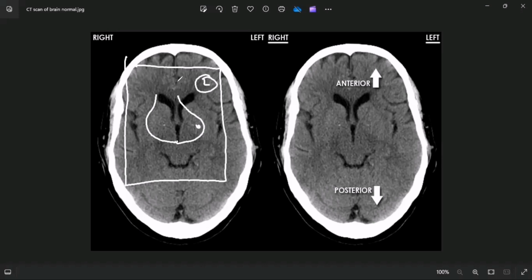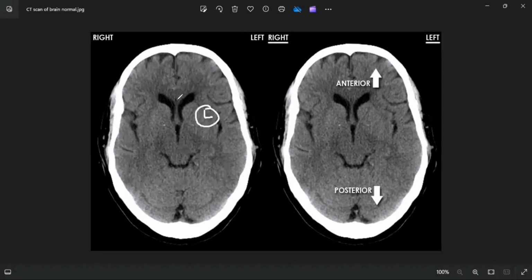So you see that the left side of the chest is here. So always assume that you are looking at the chest X-ray. So this is also your left. When you do that, you'll never forget. Is that okay?